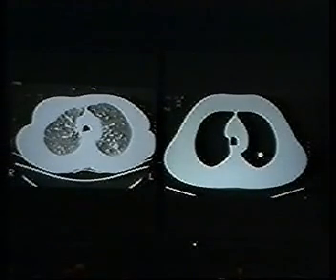Well, here's an example. A patient with breast carcinoma who presents with a solitary nodule on the left side in the upper portion of the thorax. The phantom here is assembled to closely simulate thickness of chest wall, the same portion of the thorax, the same size nodule in the same location, and the phantom is scanned.